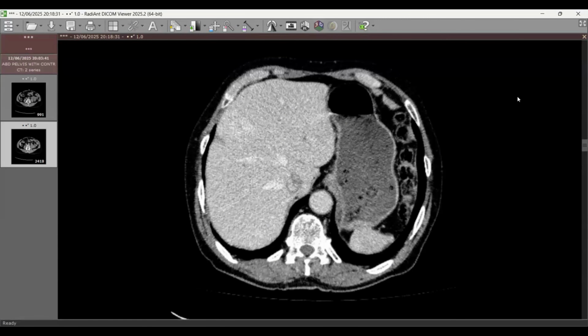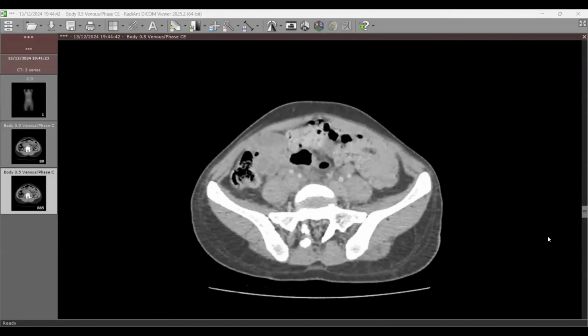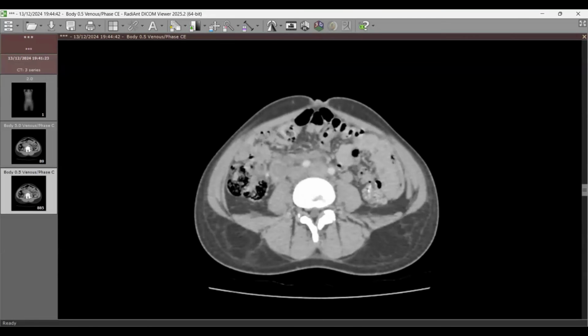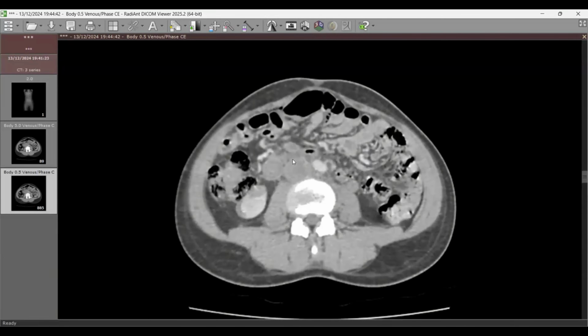Your first case, let me go back there. And I think you were a clear pass on this one. Okay, can you all see my screen? Yes, sir. So this was an enlarged ovary, and then you had these two structures. Can you see the two structures? One is this, and the other one is this. So this is the inferior vena cava, and this is the right ovarian or gonadal vein.